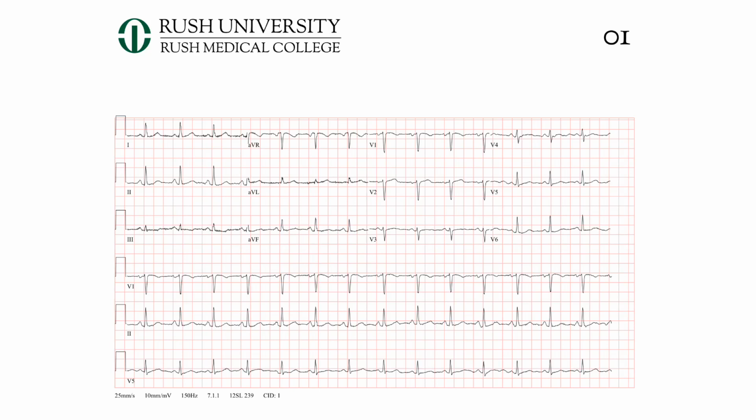Welcome to this video series on how to read an EKG. The EKG stands for electrocardiogram. The K is because it's German. Other people call it an ECG. And we're going to step through a process that will help you decipher these waveforms here.